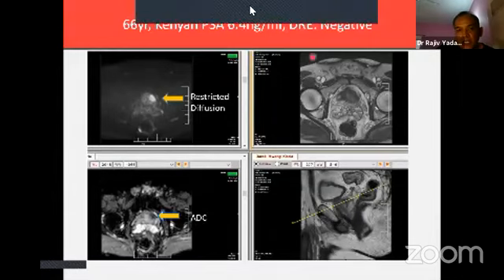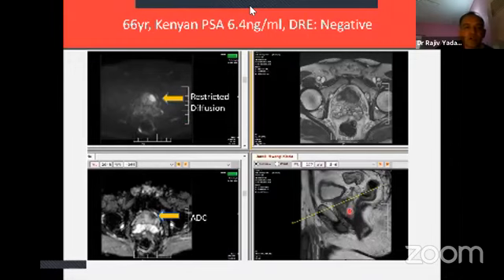On the MRI, it would look normal because the peripheral zone seems to be fine. Now, on a T2 weighted image here, there was the suspected lesion. So let me come first to the restricted diffusion. This is the diffusion weighted image, which showed a brighter spot, meaning a highly suspicious area at the left side base of the prostate.